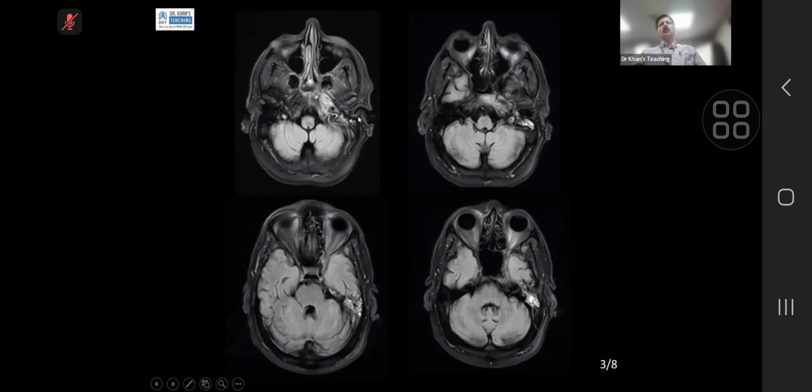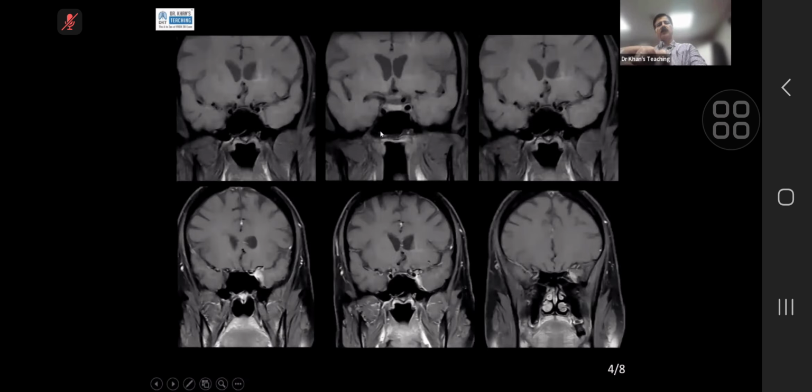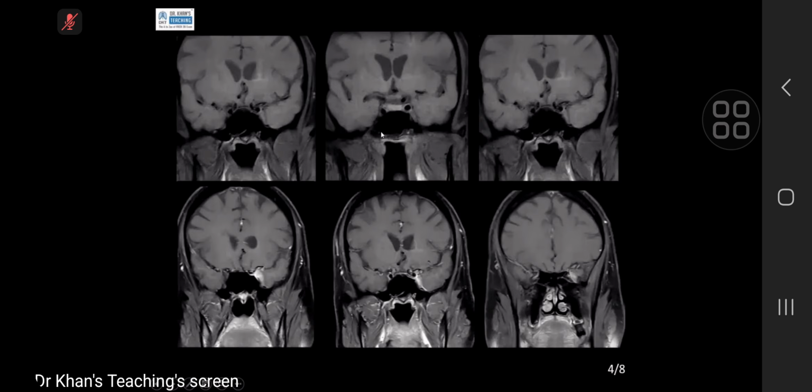This is unusual because we had done a brain type of protocol, so there was a FLAIR. But the point I'm making is that even on a FLAIR, because it is a fat saturated FLAIR, you can see something happening there. Unusual to see that. You can compare it from here. Now, this is post contrast. What's happening? On the left side, we've got high T2 signal, high T1 post-contrast signal and enhancement at the left side, where we saw the lesion within the left anterior middle cranial fossa.